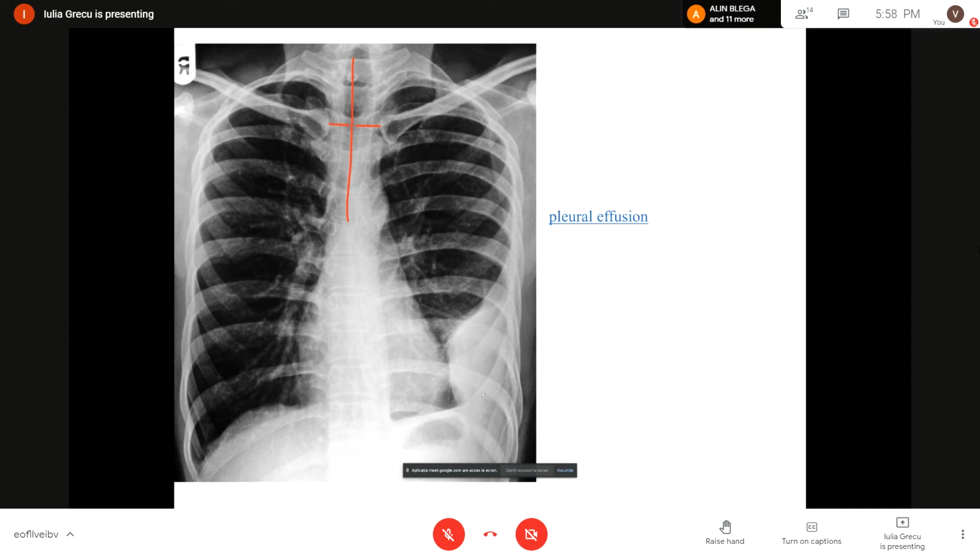When this happens, and we see this effusion from a lateral view, we see this ascending obtuse angle with the thoracic wall, and also with the diaphragm, but without the characteristics of free pleural effusions, because if this pleural effusion were free, it would extend to both edges of the thoracic cavity.